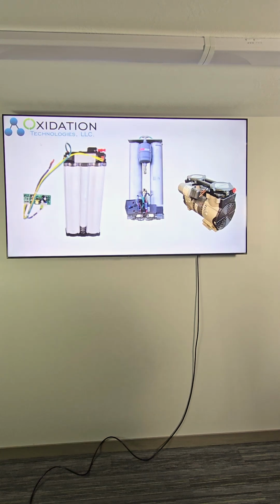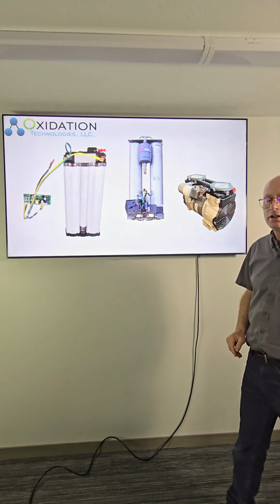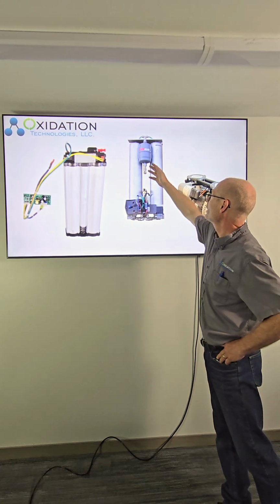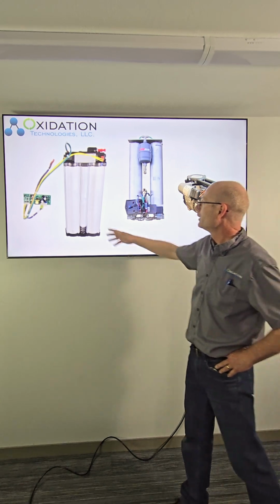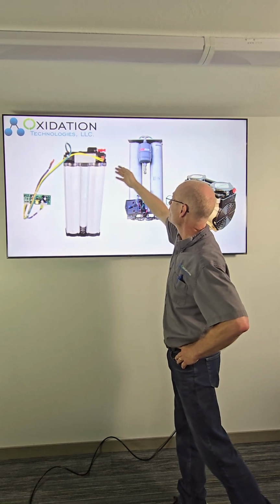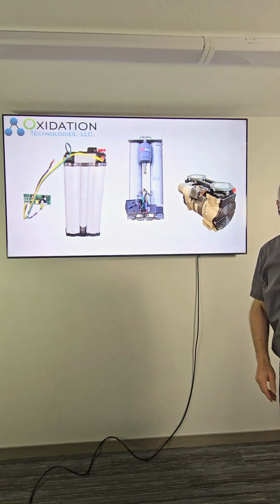This is what these components look like in real life. An oilless compressor, two different examples of these sieve beds. Two individual sieve beds. This is where your oxygen is being collected. This here's a timing mechanism. We'll talk about that. Same with this one. We've got two different sieve beds. This oxygen receiver tank is right there in the middle.